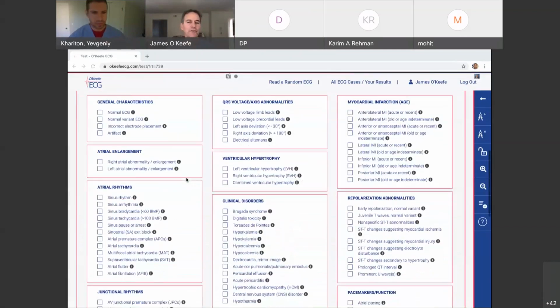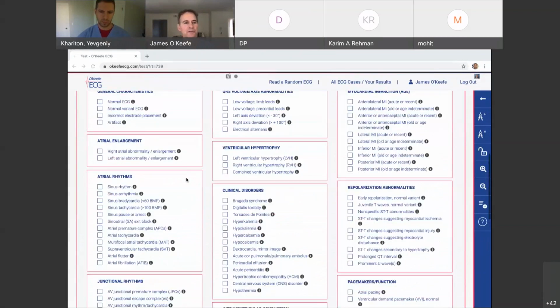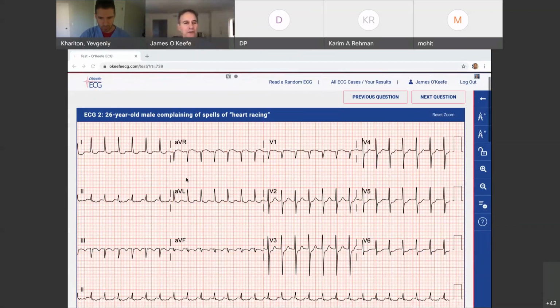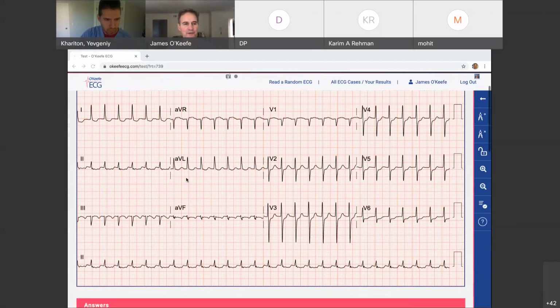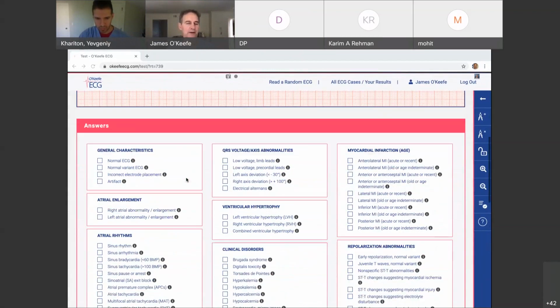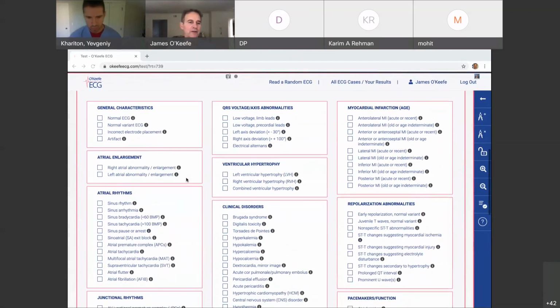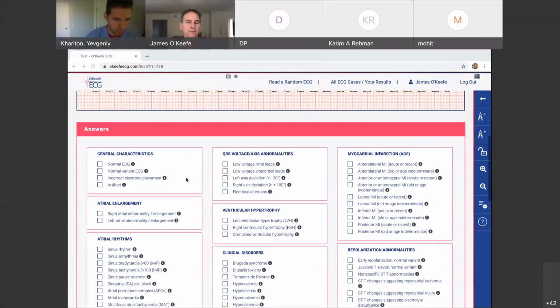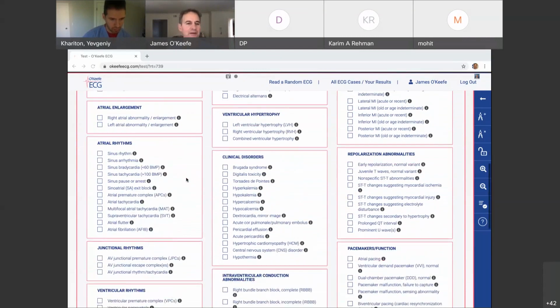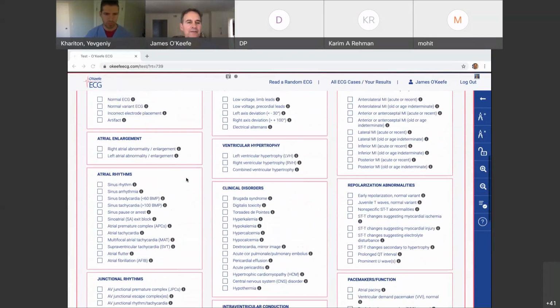All right. So for the board score sheet, what we're using to do these today is called O'Keefe ECG. It's an online teaching website that's very interactive, and I encourage you to think about subscribing to this. There are about 220 ECGs, and I'm adding more this week even. This replicates almost verbatim, with a couple of minor changes in the verbiage just to avoid copyright infringement on the board exam, but the same 89 diagnoses will show up. We'll be seeing these on the boards.